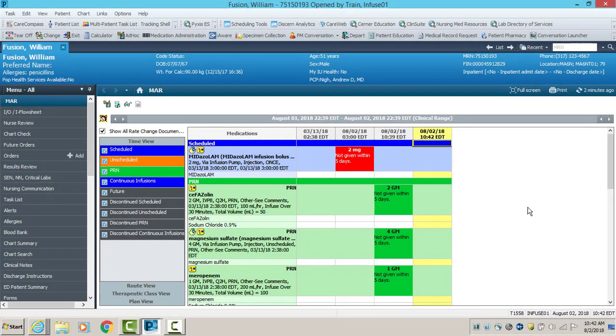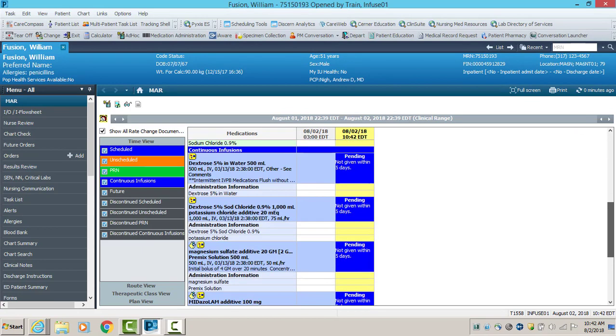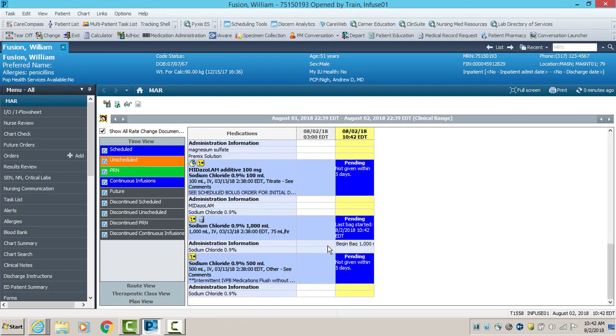The screen returns to the Medication Administration record. Let's go ahead and click the Minutes Ago button to refresh. And now we will scroll down to locate the continuous infusion that we just began. Infusion documentation will display in a timed column with an associate device icon. The icon confirms that association was successful. IV infusion rates and volumes infused will now be verified and signed in iAware, not the MAR.